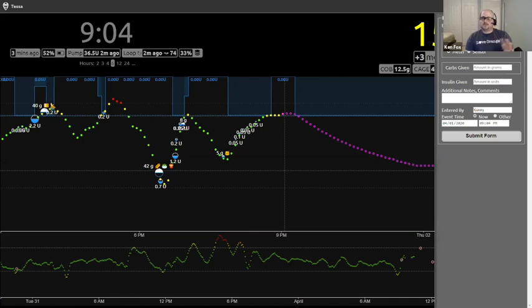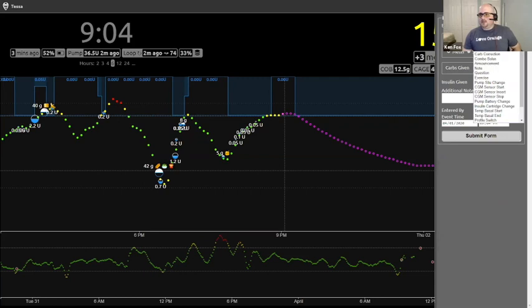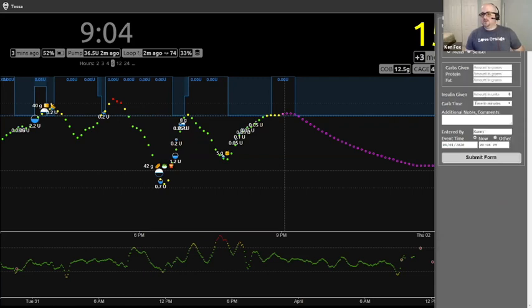So now this is where you create events. So that's what it calls events. So you could, in theory, come in here and do a bolus, right? You could enter carbs, you could enter insulin and log it in here. But again, if you put anything in Nightscout, it's not going to go back to Loop.